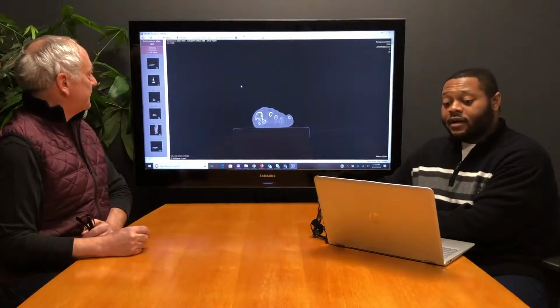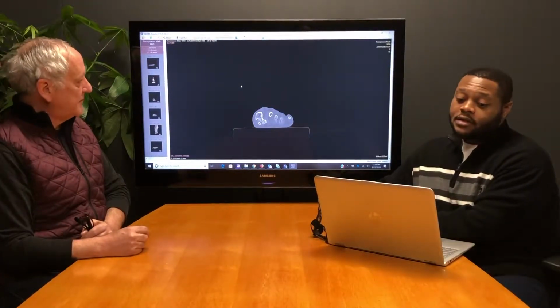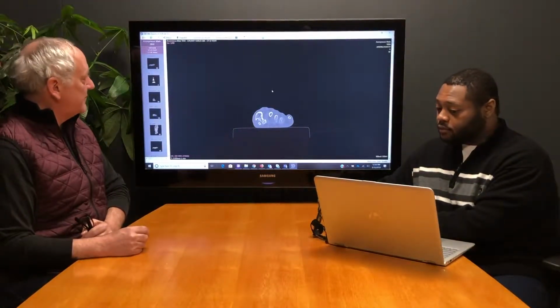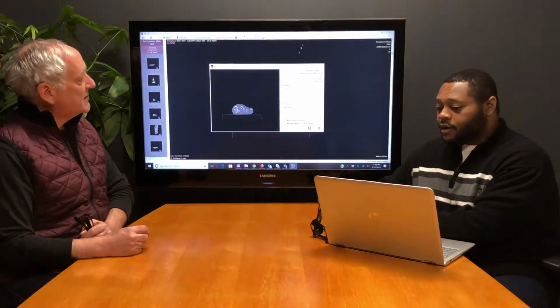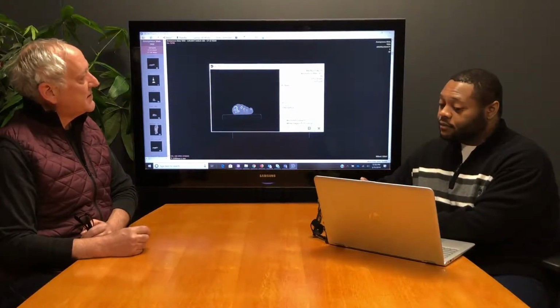All right, so if you want to share a specific series with an individual, make sure that you select the series you'd like to share. Then go over here to the share option. You're going to fill out the information for the name of the doctor, their email address, and a mobile number so that they get a secure PIN that they use when they want to access the series.